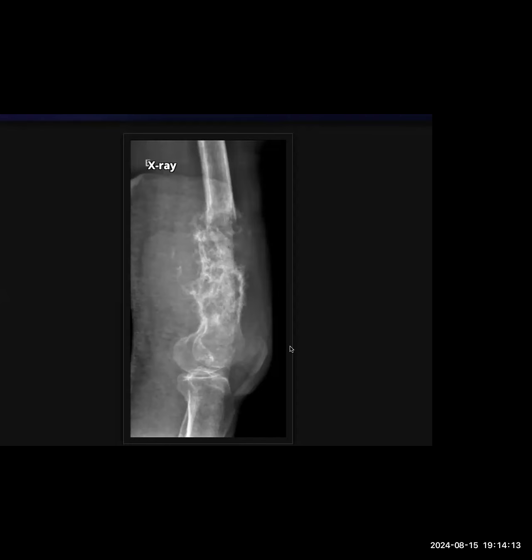You describe everything and say that I think this tumor is most likely along the lines of an aggressive bone lesion, and I would put a differential of osteosarcoma, right? And then you say that I would put a referral to this bone tumor specialist clinic or a sarcoma clinic, and a plan for biopsy after discussing with the bone specialist, correct?